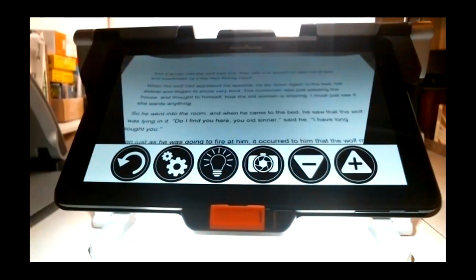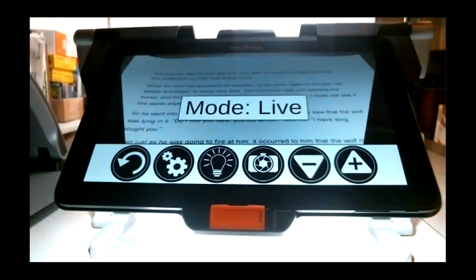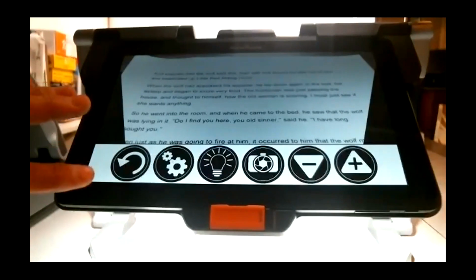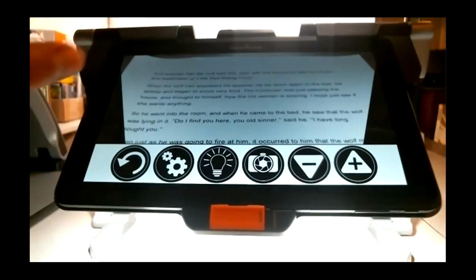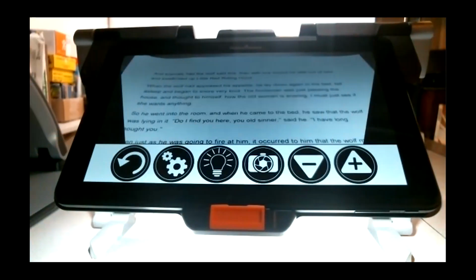Very simple. Again, it's a swipe. You don't have to go fast. Just go in a normal pace, and that's going to be on your left hand side. One finger from top to bottom. I can go the other way around from bottom to top, and that will toggle also in between the two modes. It's up to you. It's your preference as you wish.